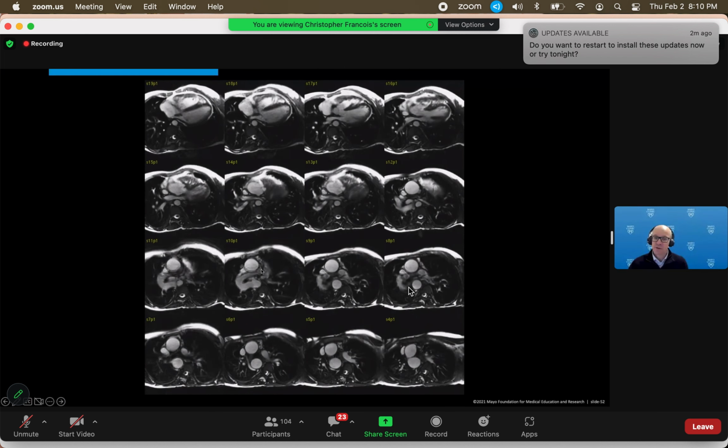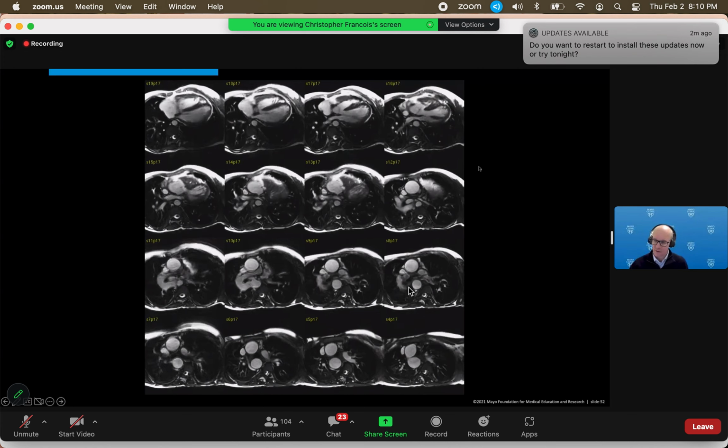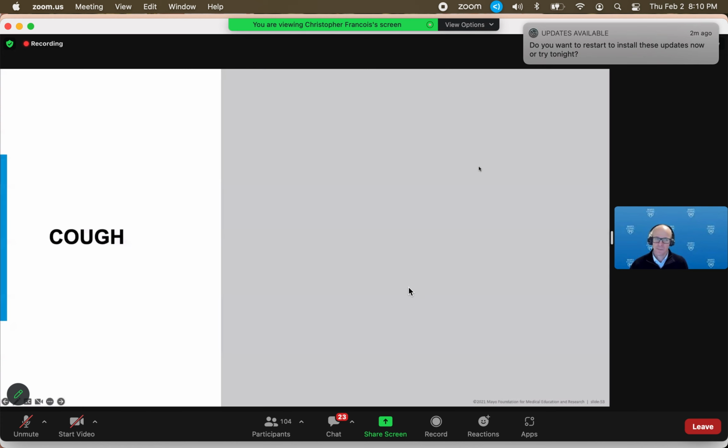Yeah, so this is the most severe form of pulmonary stenosis. If you come here to the right pulmonary artery behind the ascending aorta, it just sort of ends in a stump. It does not connect to the right ventricle. So that would be pulmonary atresia. So you have VSD, overriding aorta, pulmonary atresia or stenosis, and then the fourth thing, which is related to the pulmonary stenosis. Yeah, ventricular hypertrophy. Yes, so we have right ventricular hypertrophy. Exactly.